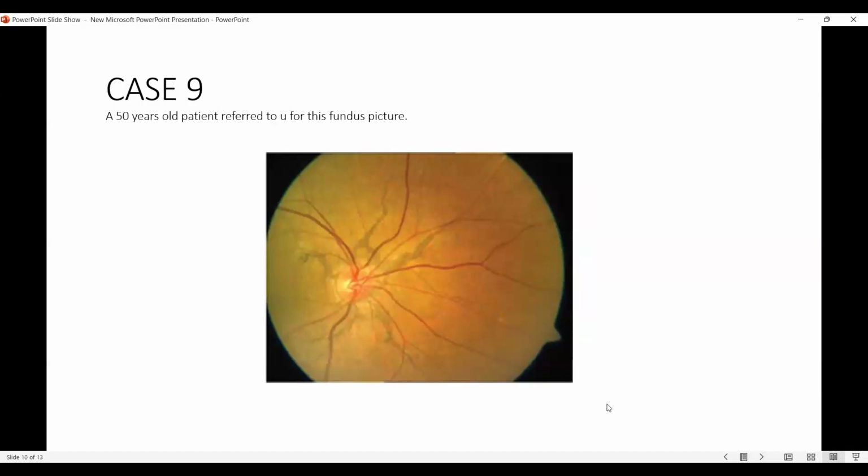I'm Dr. Vandana. Here I am seeing a color fundus photo. Media appears clear. Disc margins are clear, well defined. Cup disc ratio is 0.2, and peripapillary there are multiple breaks in the choroid and Bruch's membrane. They are deeper to the retinal layer. They are running from the side of the disc and extending into the periphery of the retina.